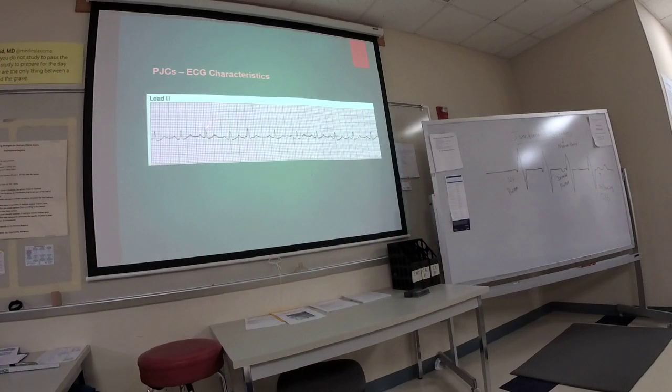And so we look at the rhythm itself. Where is that PJC? Which beat?